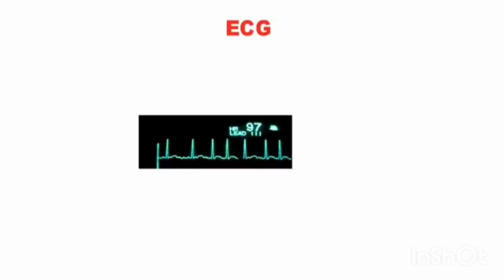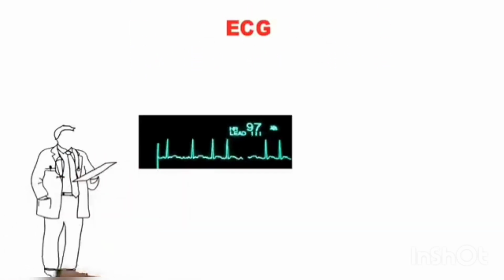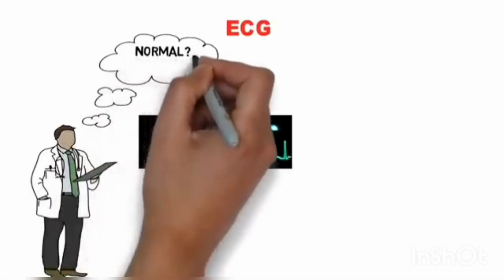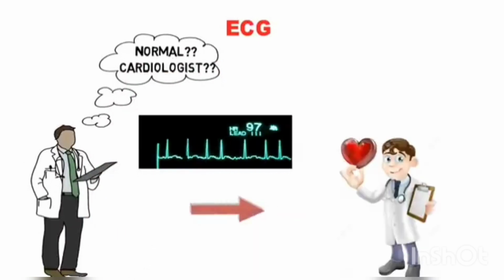So today we will discuss about ECG. This is by far the most important topic for all the medicos. Sometimes you get confused after seeing the ECG, for example like this, and you think, is this normal? Should I call the cardiologist? So in today's video, I'll try to make ECG very simple in only 10 steps. And in the end, you'll be able to diagnose majority of heart rhythms on your own.